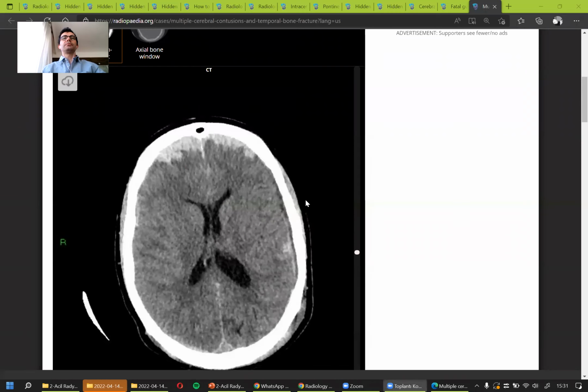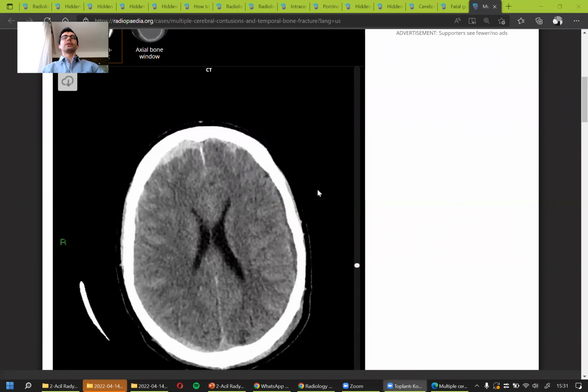Epidural. Let me show you something subdural, doctor. The subdural is something which should be under the dura, right? Subdural, as the word says. It should be under the dura, and it should be above the arachnoid space. So it should be lifting the arachnoid space a little bit, and because it is subdural, it should look pretty much flat.